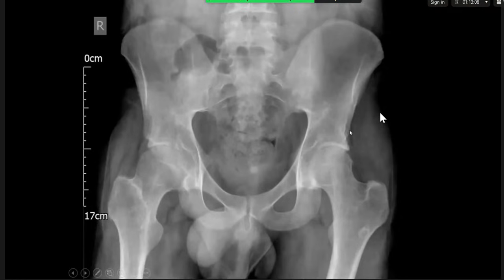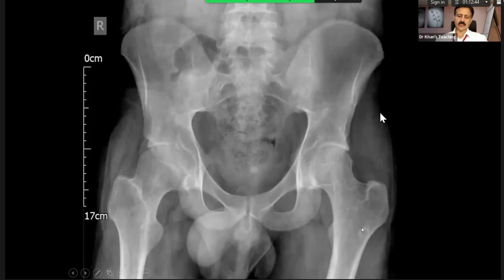Okay. So, a frontal radiograph of the pelvis in a 24-year-old male patient. The first thing that catches my eye is in the left proximal femoral shaft, there is an eccentric lesion. I am not interested here. Don't worry about it. Please continue.